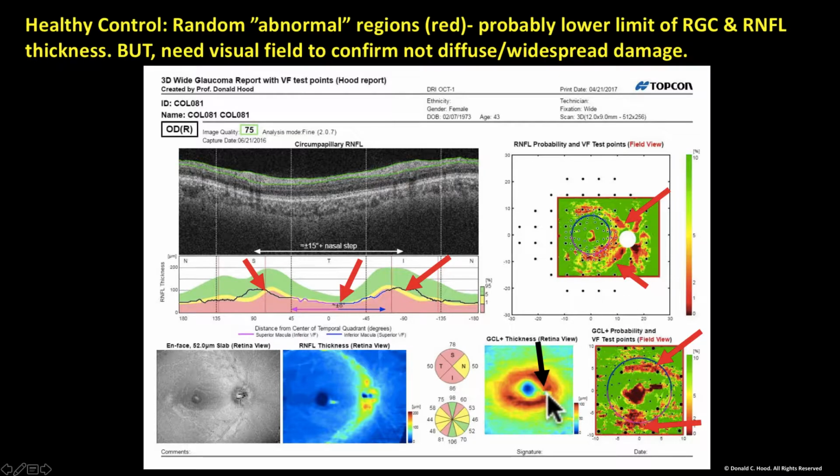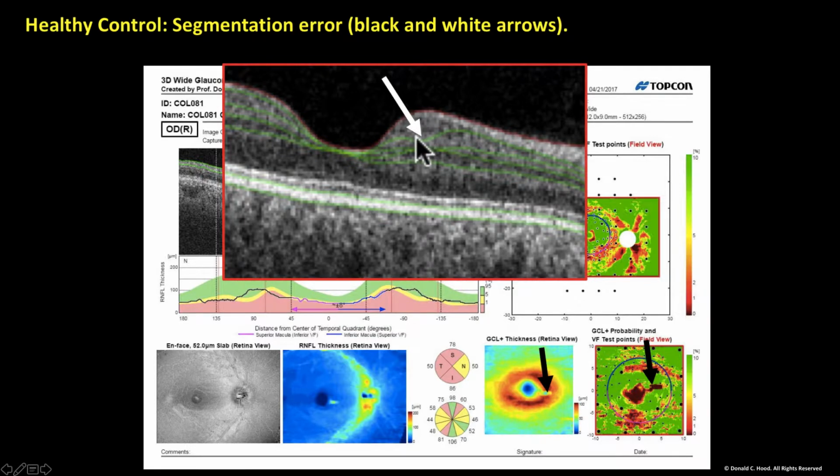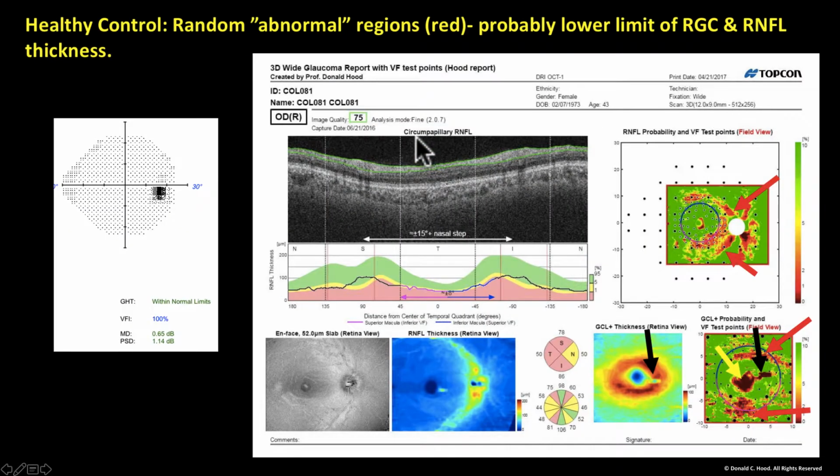Notice there's a little something going on here. What's that? Is that real? Well, there it is. If you blow it up, you can see it's a segmentation error that's producing that and that. Segmentation error. Okay.